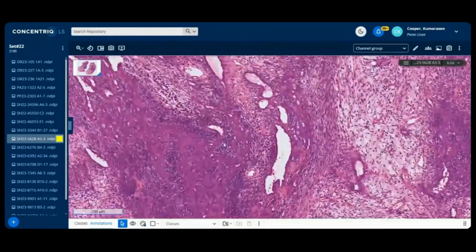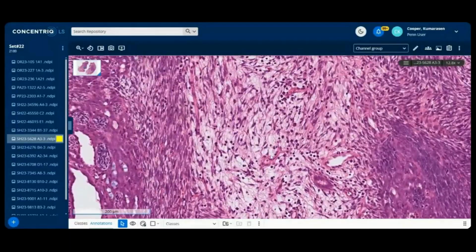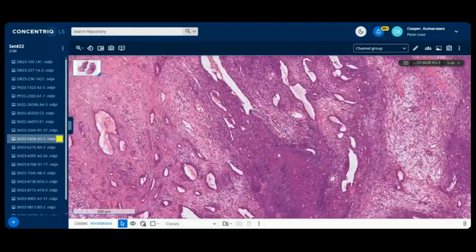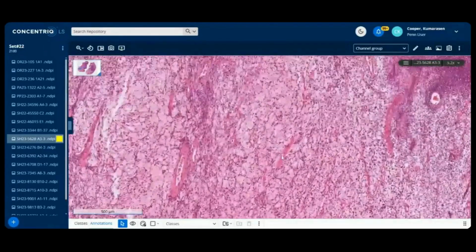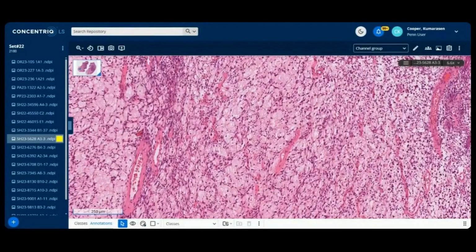Now, the reason I was focusing on these areas is that I wonder if it's truly myxoid or whether it is edematous. Nevertheless, if a needle core went through areas like this, you would not have synovial sarcoma as your first diagnosis. Like was pointed out, myxoid liposarcoma came into that differential.